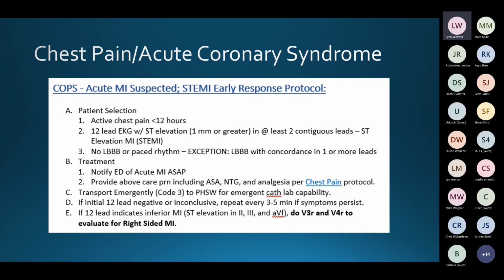We'll take care of most cases of left bundle branch block that could be associated with a STEMI. Will have concordance, and that's all you have to. The other criteria are kind of arcane and difficult to understand and to apply.